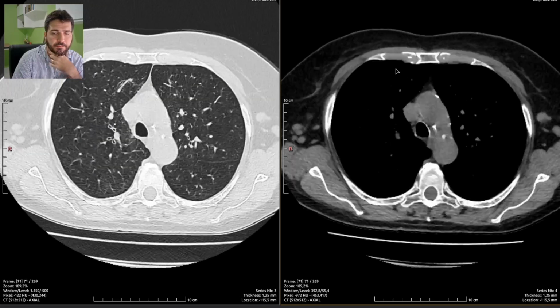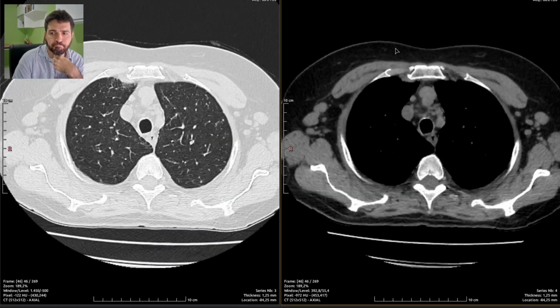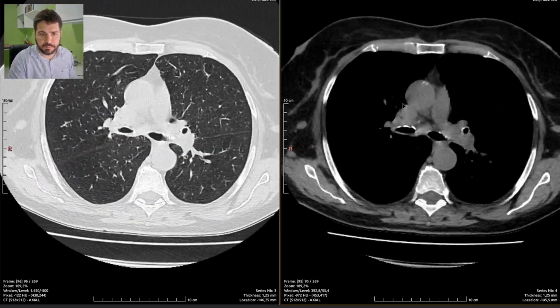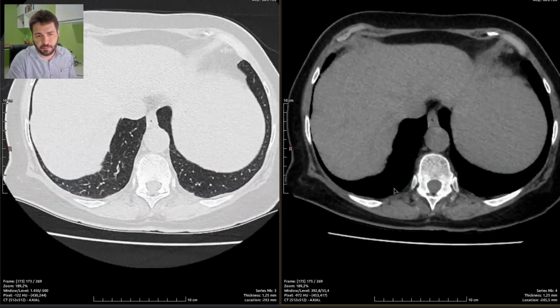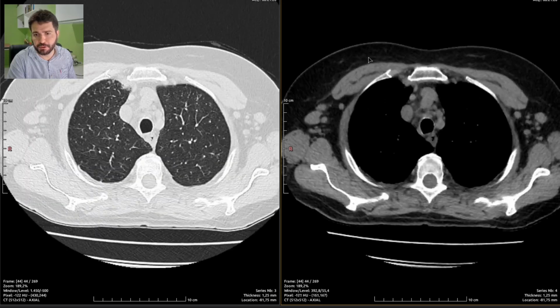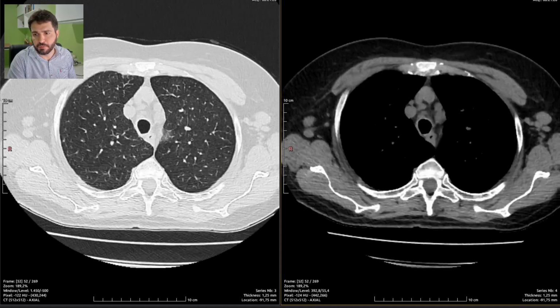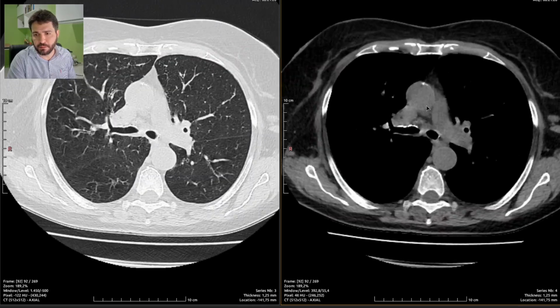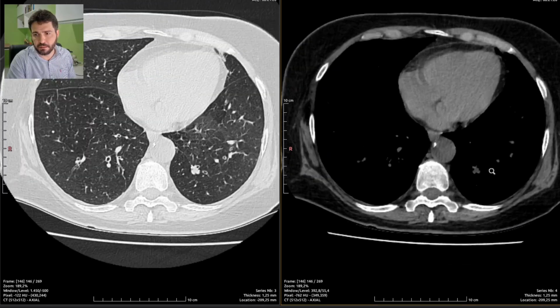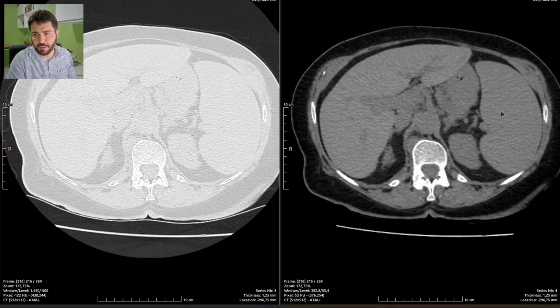showing itself in a regular CT scan searching for pneumonia. So the major concern of this patient isn't really the pulmonary signs of acute disease, but the chronic signs of lymphatic disease that could be justified by some kind of cancer, blood or lymphatic related cancer.